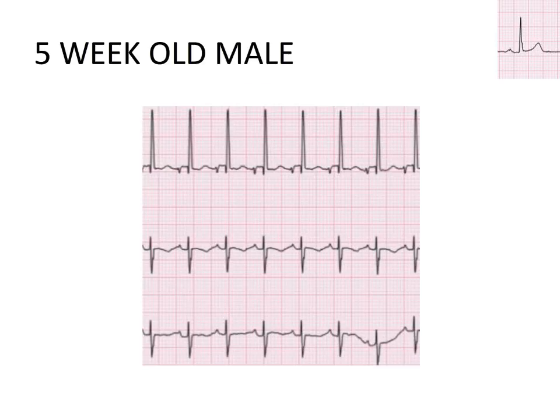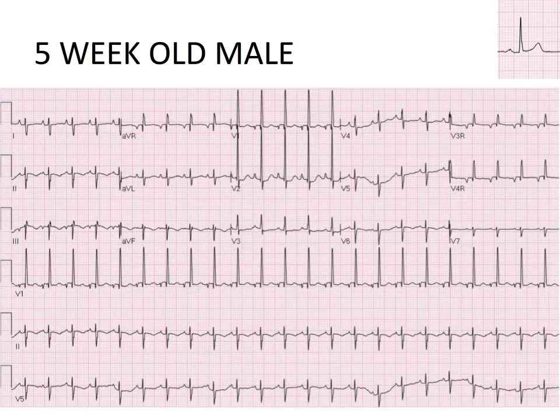Use this enlarged version of the EKG to calculate the PR and QTC intervals. Type your answers in the box and hit the submit button. You should have found that the PR is about 150 and the QTC is 401 if you use 6.5 small boxes for your QT and 10.5 small boxes for your RR. Now take a minute to look at the morphology. When you are finished, hit the next button.